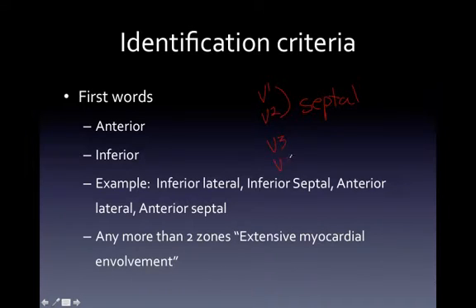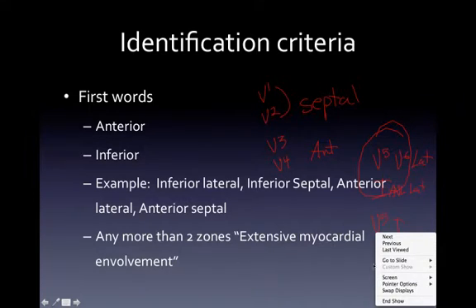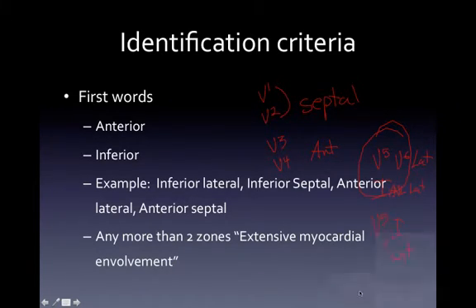V3, V4 for anterior, V5, V6 for lateral, 1, AVL for lateral, any combination of these, V5, lead 1, lateral.